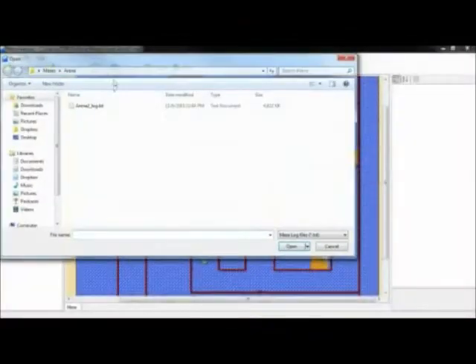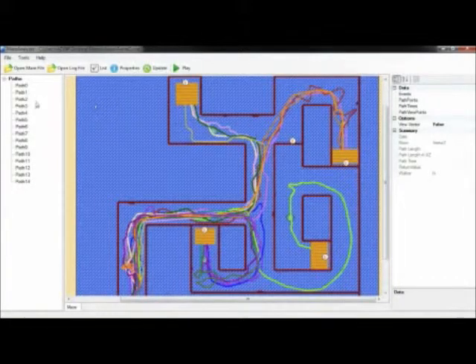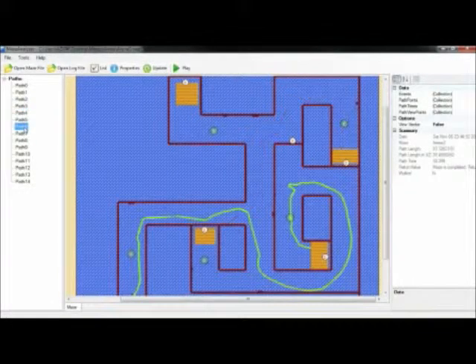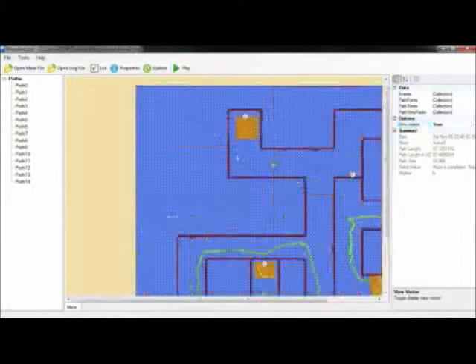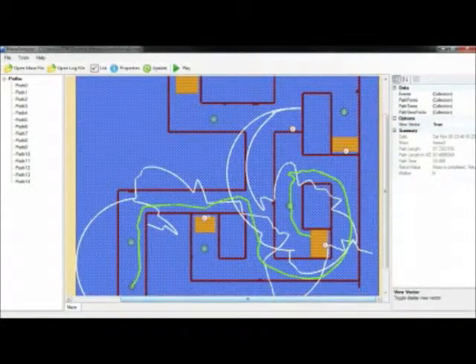With the Maze Analyzer program, Maze files can be displayed with the recorded user path for review. Different paths can be overlaid to help in analysis, and statistical information about different trials can be calculated. Additionally, collected information can be exported to Excel or MATLAB for additional processing.